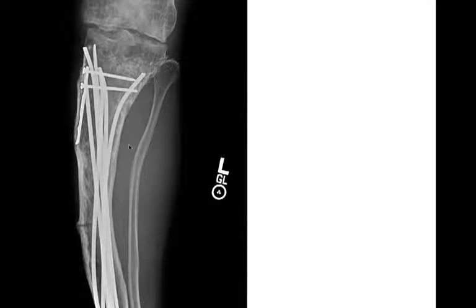Okay, so radiograph, which shows this bowing deformity of the tibia, and there's this kind of mixed sclerotic and lytic lesion throughout the tibia, proximal or distal femur, and there's a fracture through the cortex of the tibia here. There's also a bowing deformity of the fibula. So this long lesion occupying the tibia and fibula, and maybe part of the femur.